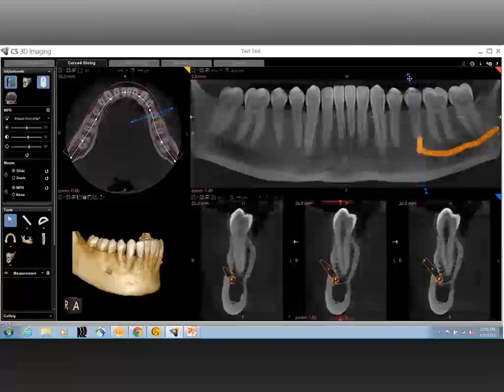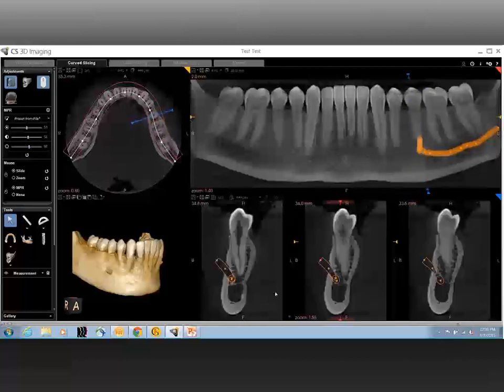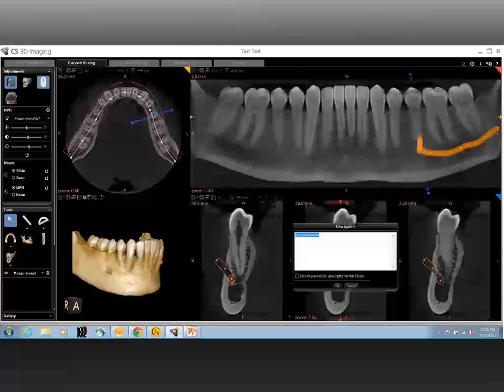Interesting. So going back to all these findings that you have mentioned, is it important to note these findings, and if so, why? Oh, that comes to essentially bookkeeping, and that's a very good question. It is important. Once you see a finding, it is important to note them in the patient chart because it shows that you have interpreted the scan and noted the findings, just like how you do it on a two-dimensional radiograph. It's a process of bookkeeping and also for medical legal reasons.